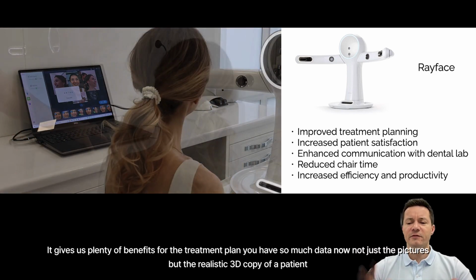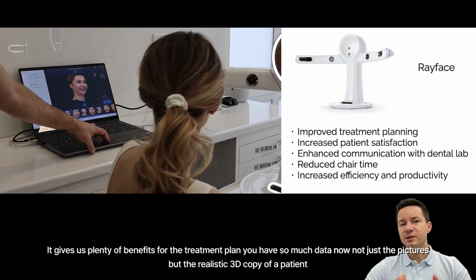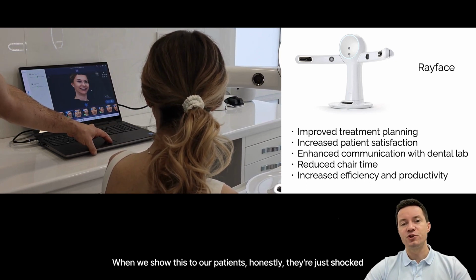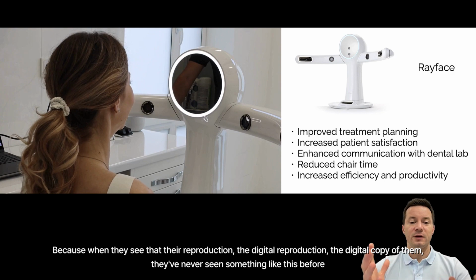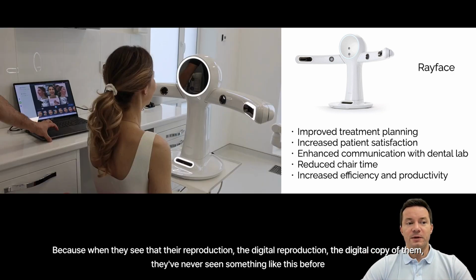Gives us plenty of benefits. For the treatment plan, we have so much data now, not just the pictures, but the realistic 3D copy of a patient. First, then the patient impact. When we show this to our patients, honestly, they are just shocked, because when they see their digital reproduction, digital copy of them, they've never seen something like this before.